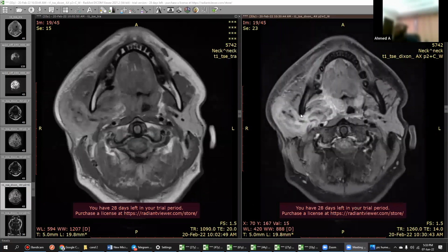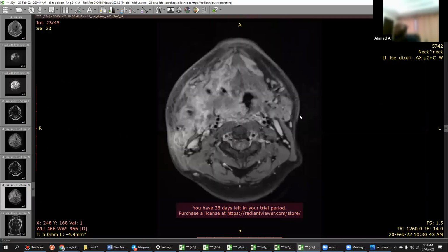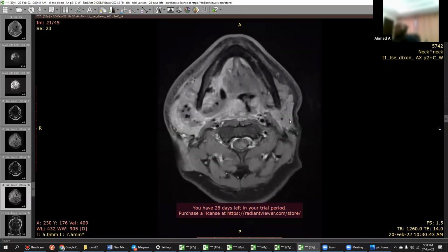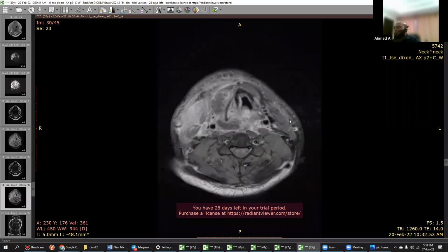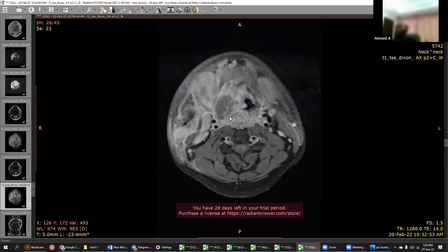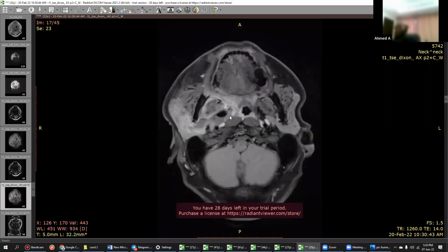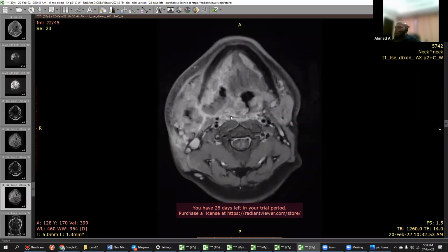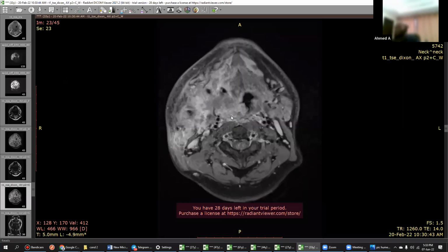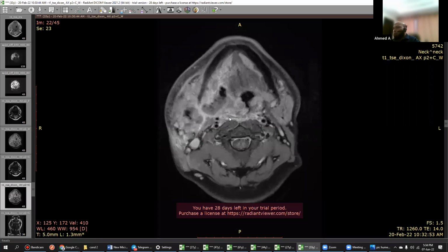This one, right? See, when it is multi-compartmental, it will usually be infective only, because no tumor will generally be so big. But anyways, you have to ask the examiner regarding the clinical picture. So that is the first point. You are right in telling the differentials, neoplasm or infection.